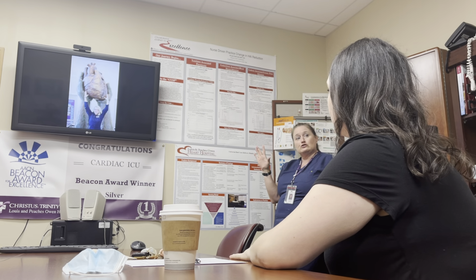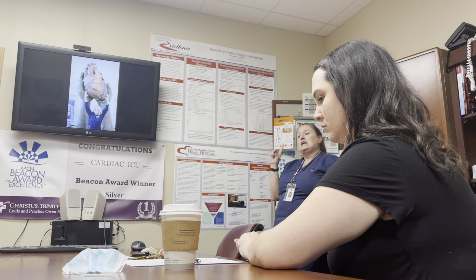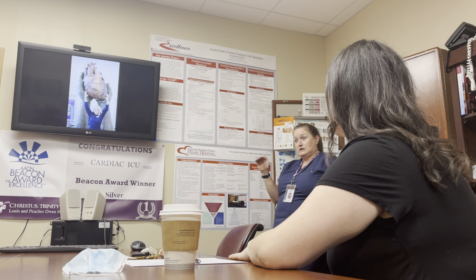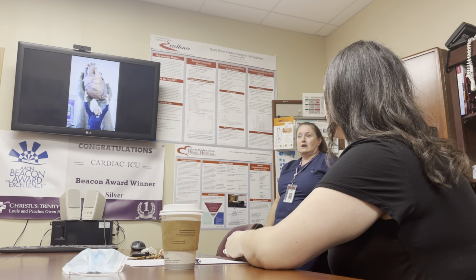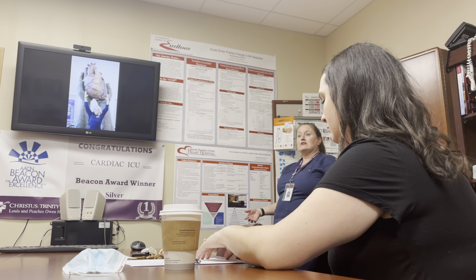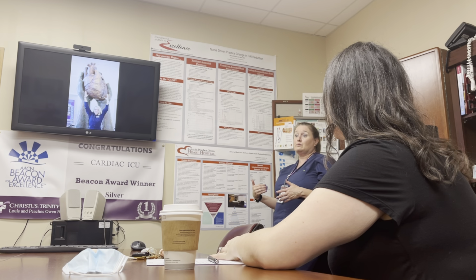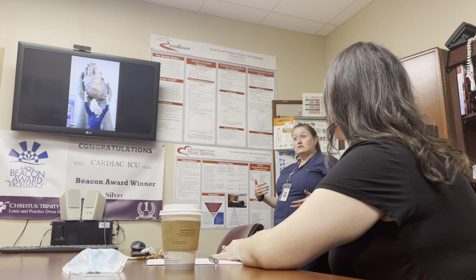So again, this was a cursory look. The main thing is the mnemonic that I gave you at the very beginning, rib cage. It gives you a basic look of how to look at an x-ray so that you don't go trying to look for something that you can't find initially. You do it systematically, and you can do that in under 2 minutes. And then if you're looking for something specific, like your feeding tube, or where's the endotracheal tube, or where's the chest tube for that matter? Is the eye hole outside of the chest wall, and that's why we're not getting any suction? Or it's constantly bubbling, and the lungs inflated type of a deal.